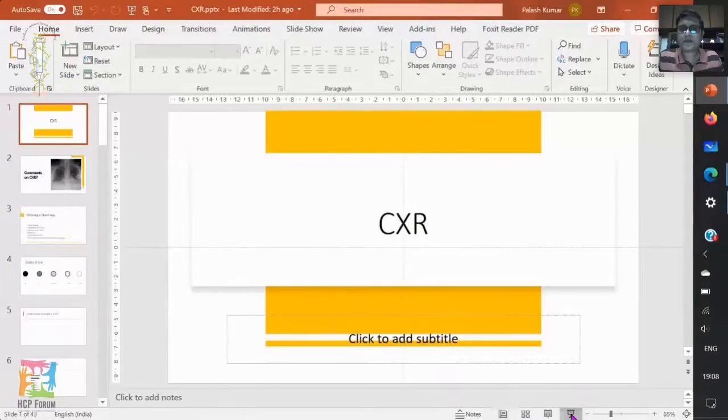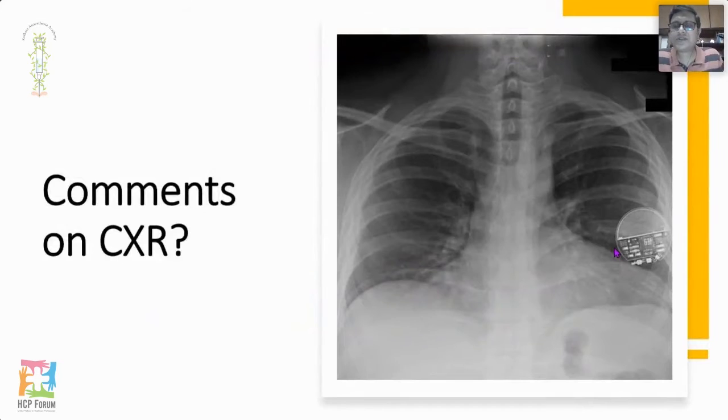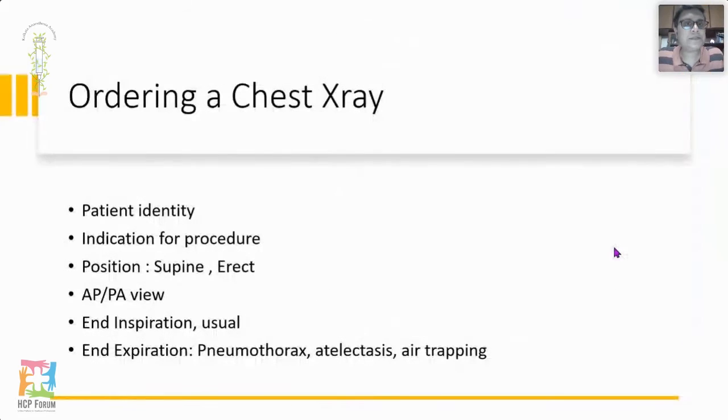So first I will begin with a chest x-ray. Okay, please have a look at this chest x-ray. We will come back to this x-ray and combine whatever we have learned in the next 15-20 minutes and see what is the interpretation of this x-ray.